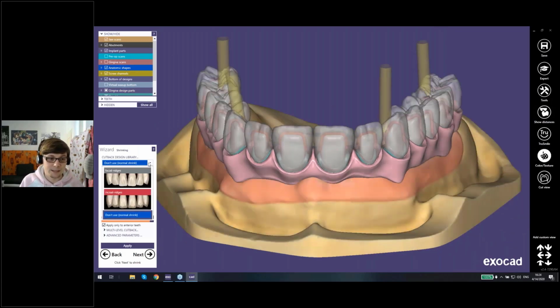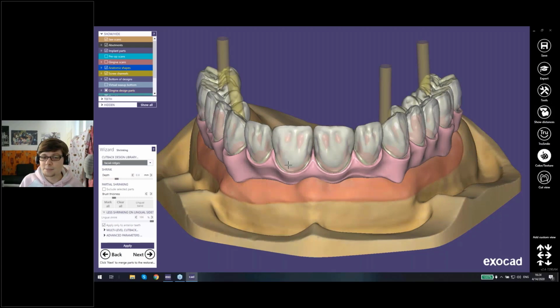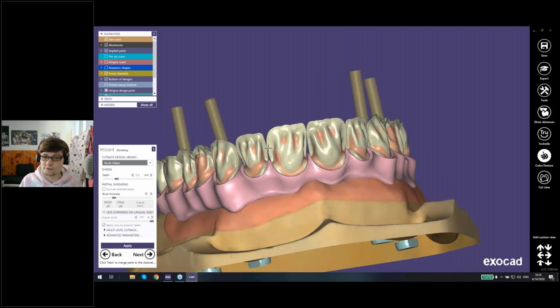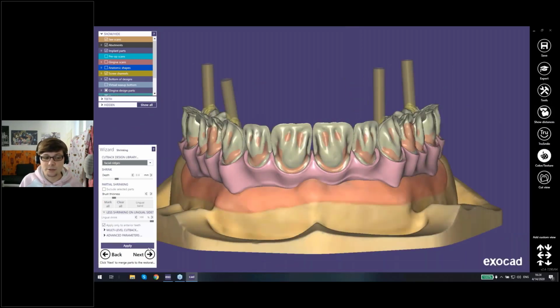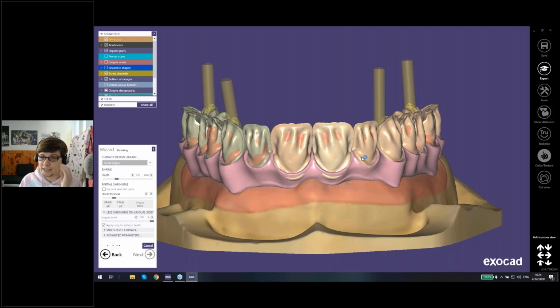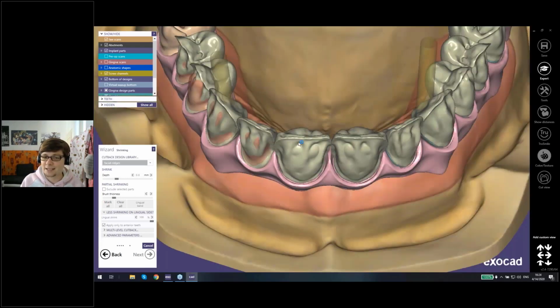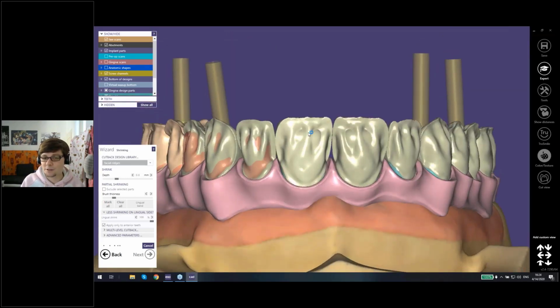And this makes sense if you select something like a cutback library, so you get like a vestibular veneering on top of it as well. So if you're using a monochrome material later on and plan to place them on top of your thimble bridge, then you can use a little bit of color veneering and all the enamel material to get a nicer tooth shape out of it. Obviously, if you're already using a multi-layer glass ceramic or something, then you can also use a full anatomic shape and still get a beautiful result in the end.